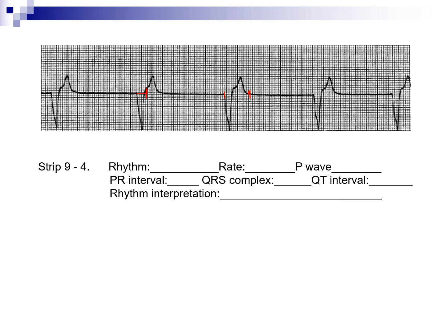Is it normal or is it wide? This is wide, and that means that most generally that rhythm is coming from the ventricles. So that's part of the rhythm interpretation, is where did the impulse originate? This originated in the ventricles, so it's a ventricular rhythm. It is slow, so therefore it is idioventricular rhythm. So we call this IVR.